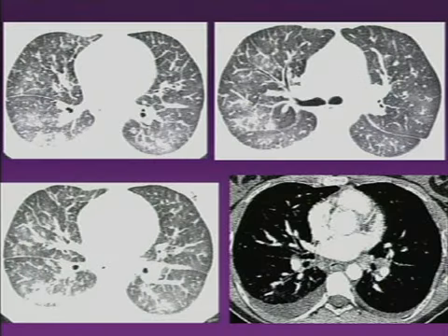This is a different patient with Legionella pneumonia. Bilaterally, this happens to be a young woman, which is a somewhat atypical clinical presentation, but she had Legionella presenting as ground glass densities with some patchy areas of denser consolidation forming in the right lower lobe. But note there is pan-lobar involvement, in this case associated with a small effusion and some reactive adenopathy in the hilar region and the subcarinal region.